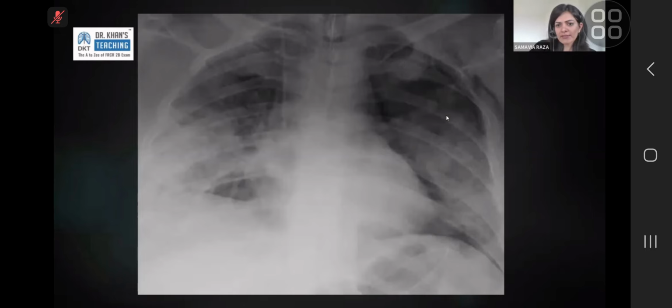I'll tell you why it isn't what you said. So, bat wing. I think one of you said that this is eosinophilic pneumonia, and eosinophilic pneumonia actually has a very textbook appearance. The thing to remember with eosinophilic pneumonia is that it crosses fissures. It's like that process does not realize there is a fissure going through. That appearance is very clearly appreciable on CTs, but on X-ray, what you would see is peripheral-looking consolidation that goes through the lung, through fissures, very beautifully. So that's a very textbook appearance of eosinophilic pneumonia. This could be, but it isn't.